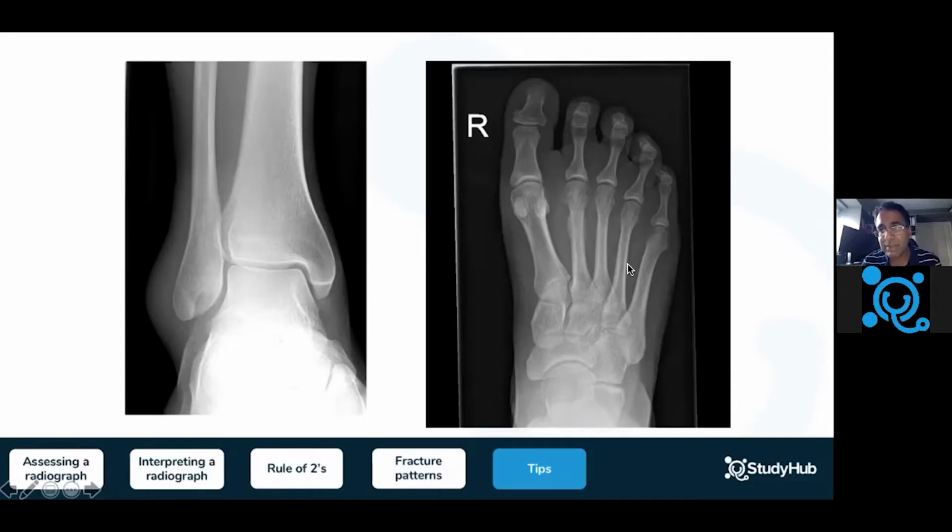And then coming on to this radiograph here, now look at this metatarsal bone. Now that's nice and smooth, almost smooth, again fairly nice and smooth. But when you come here, you've got sort of a little protrusion on either side. It's like a swelling on either side of the bone. This is what is called callus formation. So this is a patient who had a stress fracture. So perhaps through repetitive activity, they have sustained small microfractures over here, which over time, he gets a microfracture, it heals a little, he gets another microfracture, it heals.